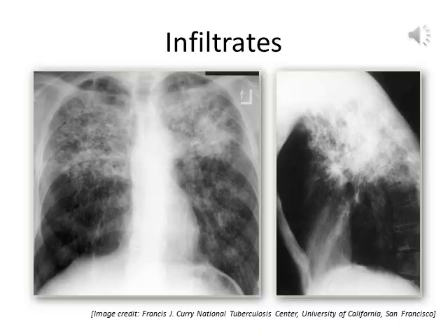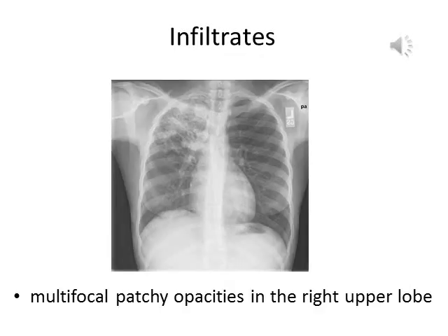These X-ray pictures from the posterior anterior view and side view show extensive pulmonary infiltrates on the apical parts of both lungs. These findings are consistent with TB. However, pneumonias caused by other pathogenic bacteria could also present with a very similar picture. This is another X-ray showing multifocal patchy opacities in the right upper lobe of the lung. This is also an image of pulmonary TB, which could be shared by other types of pneumonias and therefore not confirmatory for TB.